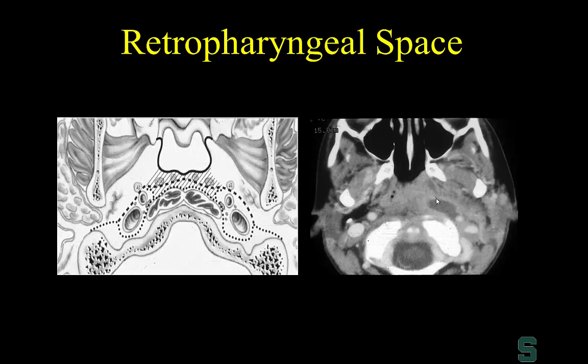This is actually a suppuration or liquefaction of a retropharyngeal lymph node. So when I started out years ago, we would always call these retropharyngeal space abscesses. But when you see something that's this rounded, just medial to the carotid artery, that's lateralized like this, that doesn't cross the midline, in a patient that has infection, the true diagnosis is suppurative retropharyngeal lymph node. And the reason that's important is that now these patients, if we see this radiologically, can be successfully treated with broad-spectrum antibiotics.